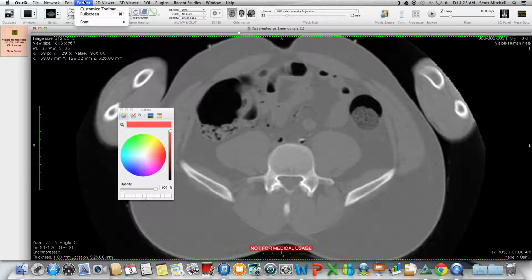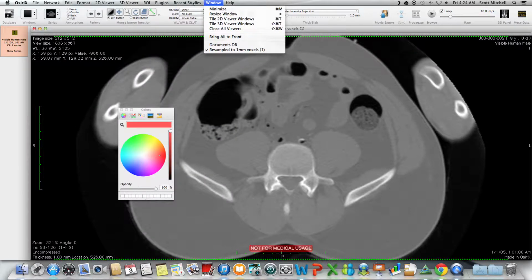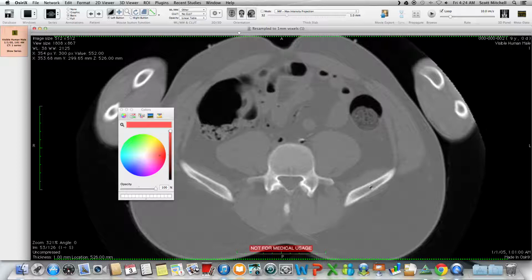There's a lot of things you can do. One of the important things with any of these segmentation software programs is to threshold, which basically means you're going to create a mask for certain Hounsfield units. As I said, Hounsfield units is basically the intensity. So you can make a window of, say, everything above 100 Hounsfield units, and it's going to be basically bone and metal.